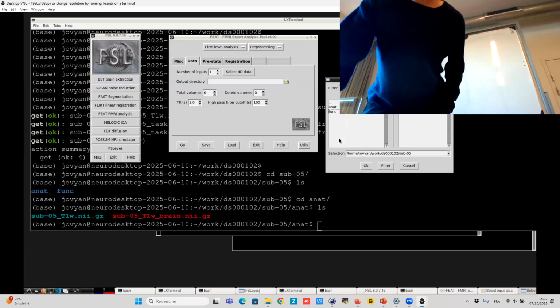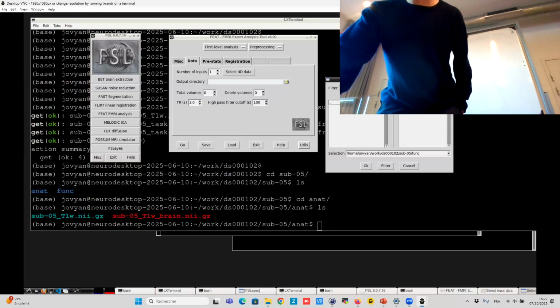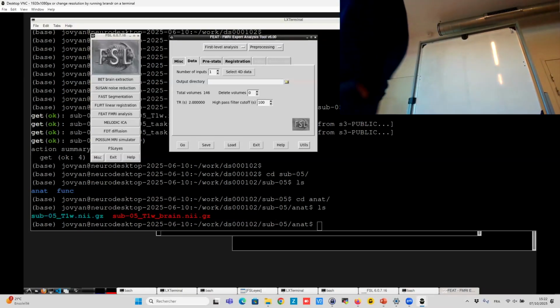Let's select my subject 5. Functional. So let's take the first run. Okay. You click OK, and you click OK again. Okay.